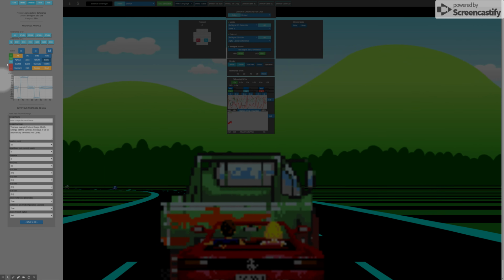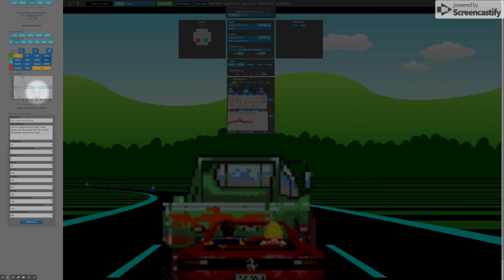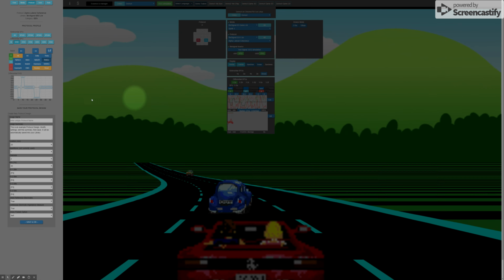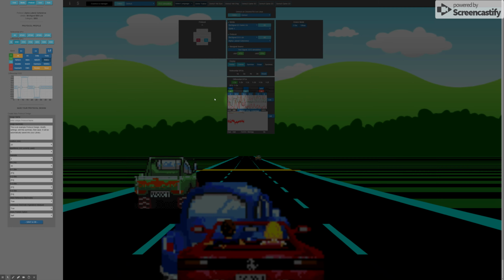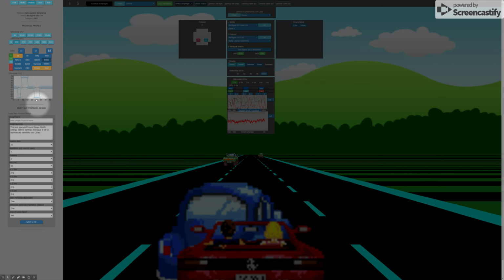Differential. No, it's not, because we're looking at this fellow here. But you can see the similarity between this one and this configuration here. Now, let's do that again. We click on beta high. We can see that we've changed it there as well. So there are real-time changes in the protocol under this side panel.